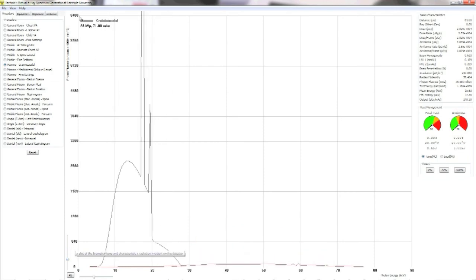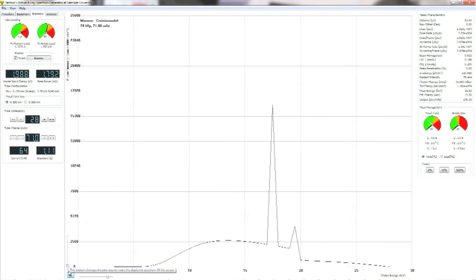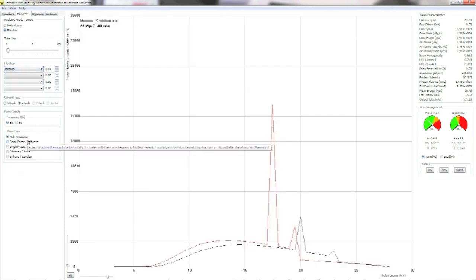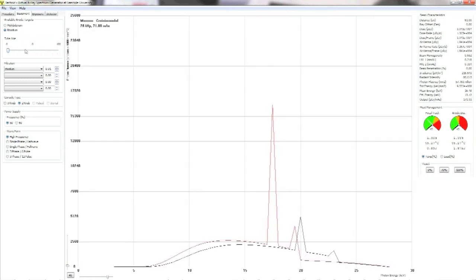It can show the X-ray output as a histogram of the photon energies in the spectrum in real time. It uses the most sophisticated maths and the most up-to-date data from the US National Institute of Standards and Technology. This histogram is the sort of graph all students have seen in countless physics books, but this one is different. It moves. Simply by altering any of the technical factors, the effect can be seen. Filtration can be changed, tube voltage, tube charge, and more.